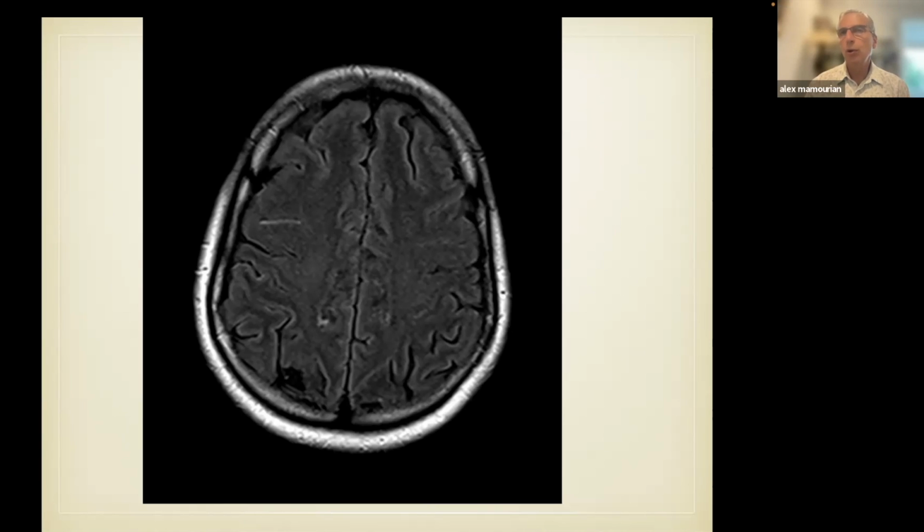Okay, so there are two parts to that analysis. And this is the same sort of thing we confront when we ask how accurate CTA is for detection of aneurysms. The first part of the question is, who's reading the scan? As you saw with that other CT scan, sometimes the detection of subarachnoid hemorrhage is very difficult. Can we be confident that with the best possible reader, we'll pick up 100% of subarachnoid hemorrhages in the first 24 hours in patients with a ruptured aneurysm? And the answer is no.